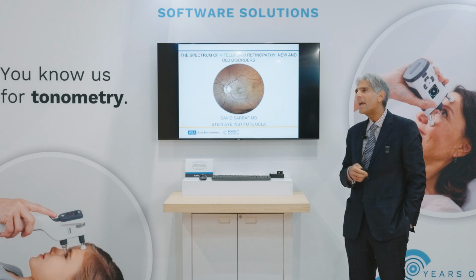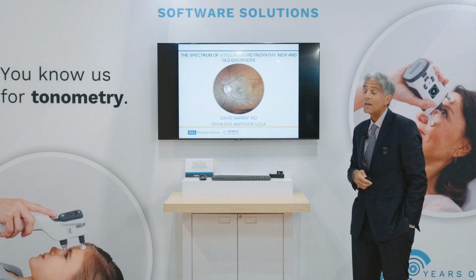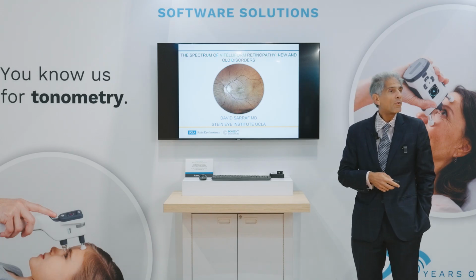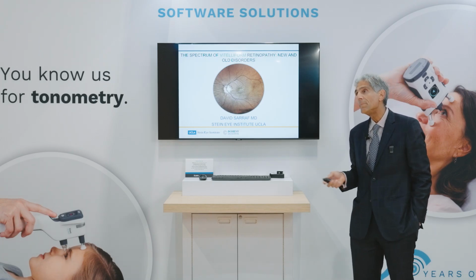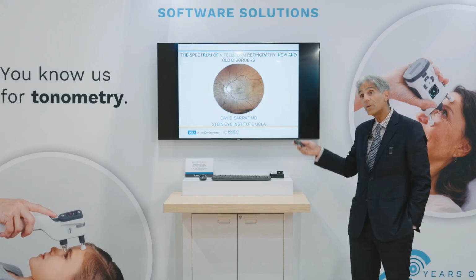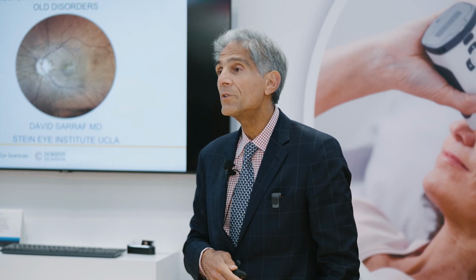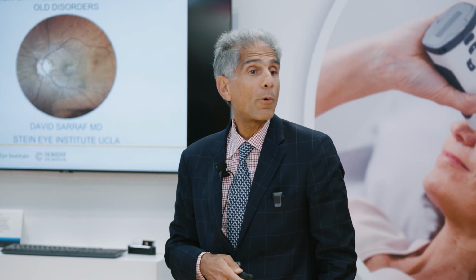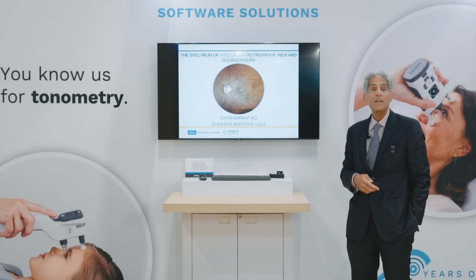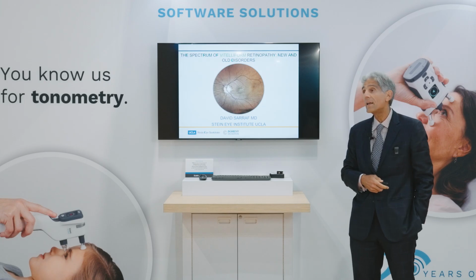There have been many vitelliform disorders that have been described over the years. Some you would be very familiar with, such as Best disease. But over the past several years, through the benefit of all the advanced retinal imaging that we have available, including these wonderful color fundus cameras, we've been able to study some newer vitelliform dystrophies. Shouldn't use the word dystrophy, they're more acquired lesions that do not have necessarily a genetic etiology.